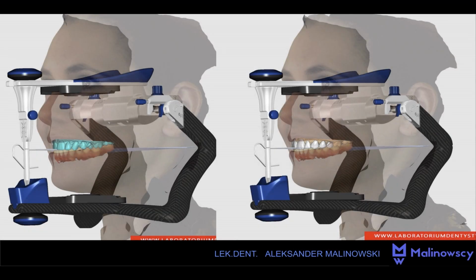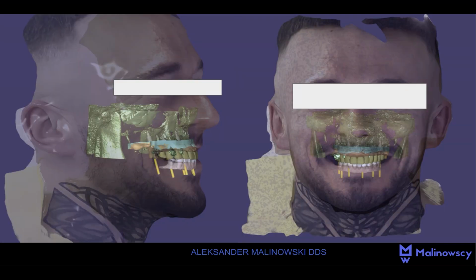This is how we work with a digital articulator. It's positioned by the fact that the facial scanner autonomously marks the arbitrary hinge axis due to the Camper-Tragus method. Here you can see that we can integrate the tomography with facial scans. It's very useful in these cases.